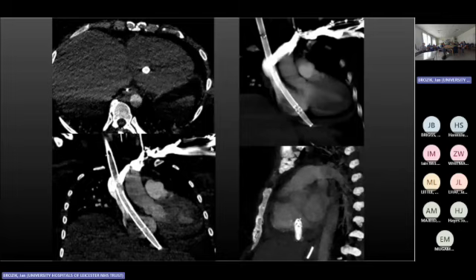They went through the right atrium into the pericardium. So it can happen. It is all on chest X-ray, but sometimes we fail to appreciate the change. It's a series of images. So it's present. This is how deep it went into the pericardium. It was still working fine.